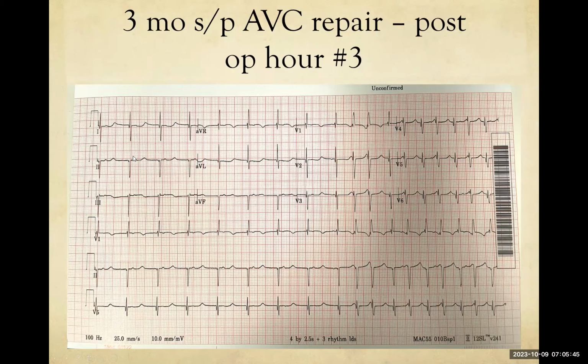So this is like some kind of a junctional rhythm with a slightly slower sinus rhythm, and then the patient starts developing tachycardia at a little bit slower than 150 beats per minute, maybe about 150 beats per minute, and there is ventriculoatrial dissociation.